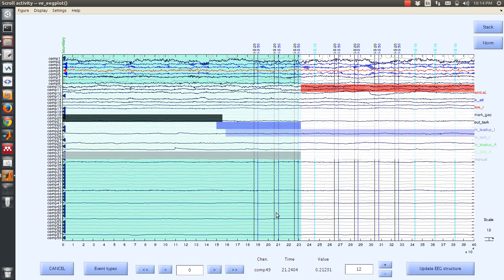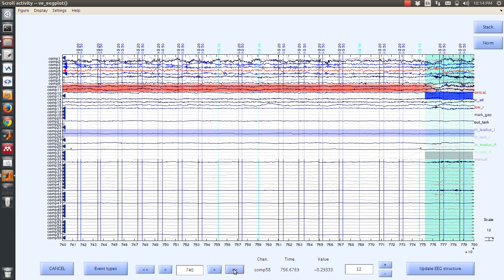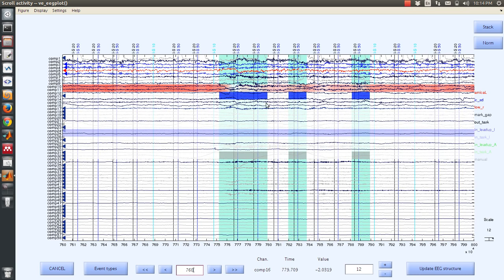Now, in this case, the red annotation is actually a continuous variable rather than just a 0 or 1. And this is the likelihood of Amica. So where this red bar is represents any period of time that was included in an Amica solution. What we can do is find periods of time that were actually problematic for the data. And I know there's one over here somewhere. So we'll just go through and look at this. In this case, right here, we can see that there was a period of time.